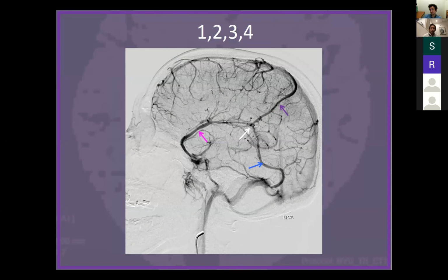Number two is this concept that we've emphasized throughout these venous lectures: the concept of balance. Veins can be interconnected or not. Some can be dominant or not. I think the same thing applies for posterior fossa veins. Here's a lateral view of somebody who has a very balanced distribution. Here's the Trolard, Sylvian veins, Labbé, and you see how they're interconnected over here. Of course, that doesn't have to be that way. Veins are like fingerprints. Everybody's unique.